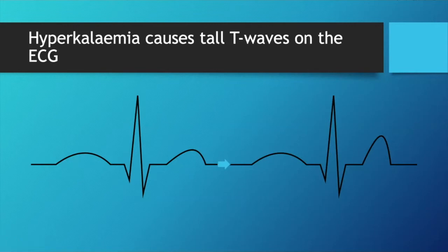Okay. But we're not trying to reach severe hyperkalemia. We're not trying to diagnose hyperkalemia. What we're trying to diagnose is the first signs of hypoxia. We're trying to diagnose when the first glycogen is being broken down to give glucose, hence the slight increase in potassium that happens with that. So what we're looking at is trying to assess how tall the T wave is compared to the QRS. Because the QRS is pretty much stable for most of the ECG, unless there are severe changes happening. The height of the QRS is pretty stable.